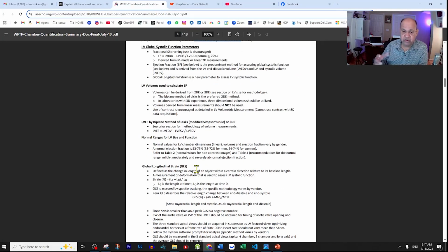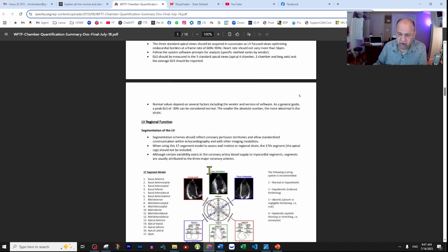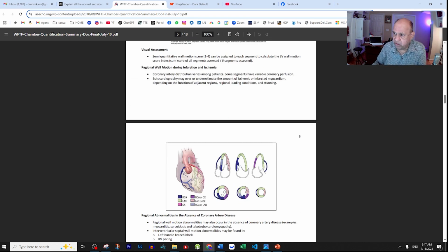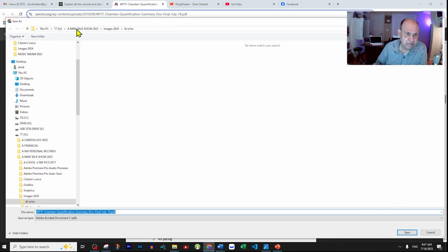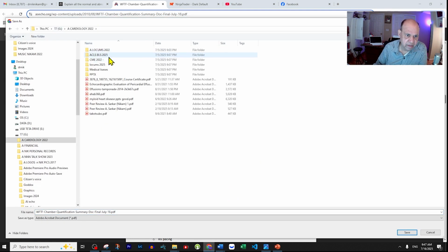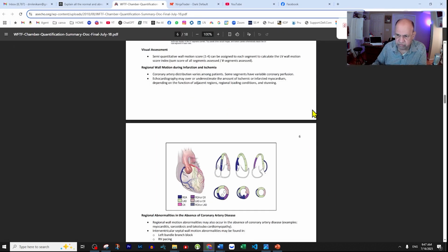So not only do you have access to general interpretation, differential diagnosis, supporting documentation, but also references to articles which may be very difficult for you to find. In fact, I'm going to download this article and save it under my echocardiography, or rather my cardiology section. This is very useful for me.